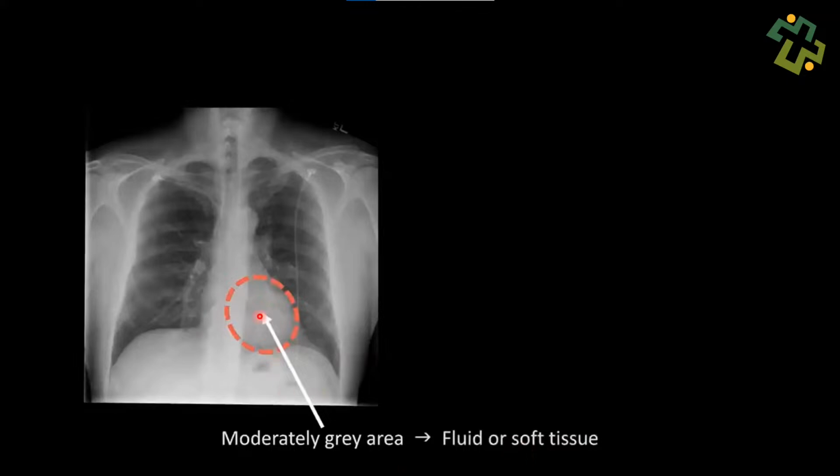And since the layout of the human body is amazingly consistent from person to person, each major line and shape on this X-ray corresponds with a known and identifiable anatomical part. We will then, obviously, in the next lesson, review these different anatomical parts. But before then, here are a few practical things to put out first.